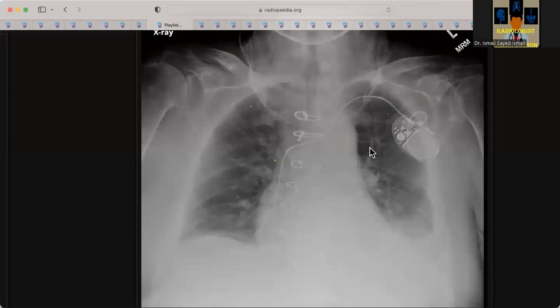Yes, I do agree there is some upper lobe diversion, but with cardiogenic, not necessarily. It's usually bilateral, but not necessarily. So here, this is just a simple pneumonia, and this is just a parapneumonic effusion. So just look at the images, try and find out what's the cause of the pleural effusion. Well done, and you've managed it correctly.